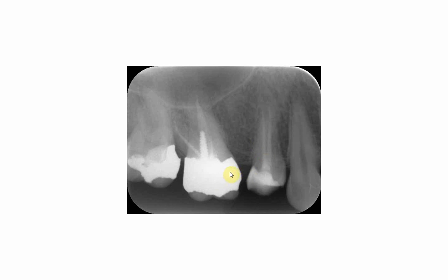In this radiograph, we can see multiple fillings. One, we can see a composite filling over here, a DO filling, and a root canal filling. See the radio opacity of the gutta-percha compared to the composite. In this tooth, we can see an amalgam filling, a very big MOD filling, with a prefabricated post screw.